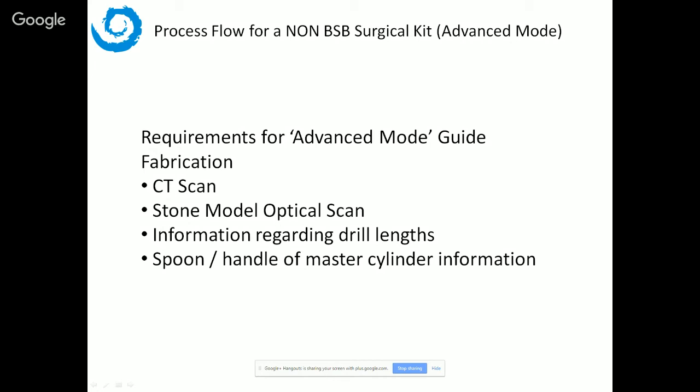The exclamation mark that comes up on the implants is a validation tool. By default, there's a panel in the software for implant distance between adjacent implants and between the implant and the nerve. There are default settings in the software for 2 millimeters and 3 millimeters. You could change them if you like, but if you see a red exclamation mark that comes up on the implant, it means you're violating a default setting to warn you that implants are being placed too close together or too close to a nerve. Okay, now we're going to jump back into the advanced mode.